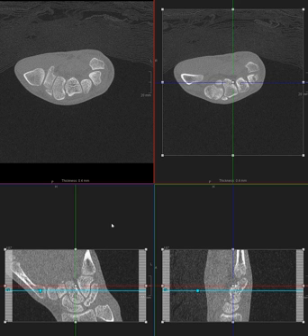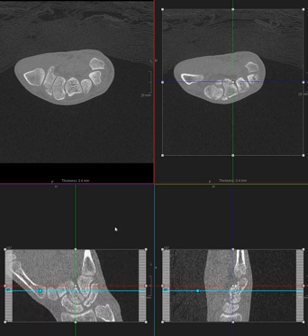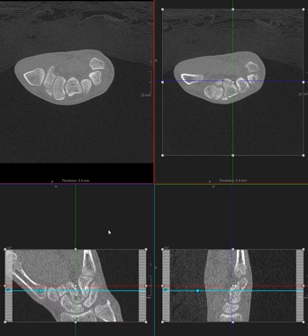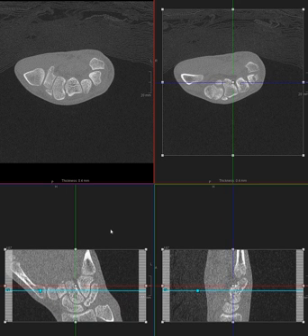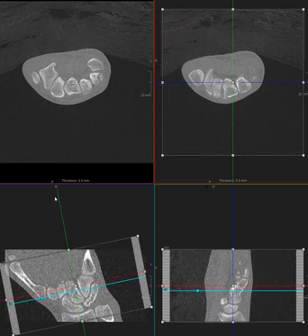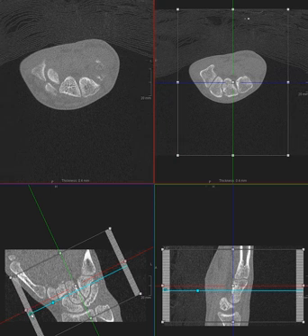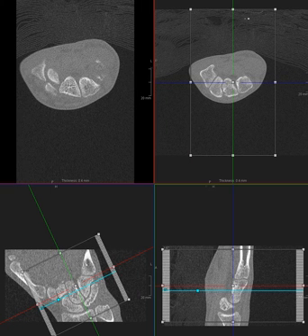But anyway, as you're looking at the wrist and joints in general, we like to reformat images according to the joint we're looking at. So in a normal wrist, this is not the scaphoid alone. In the normal wrist, we would probably tilt this and cone in so that the images would be aligned according to the axis of the wrist and not to the tabletop position.